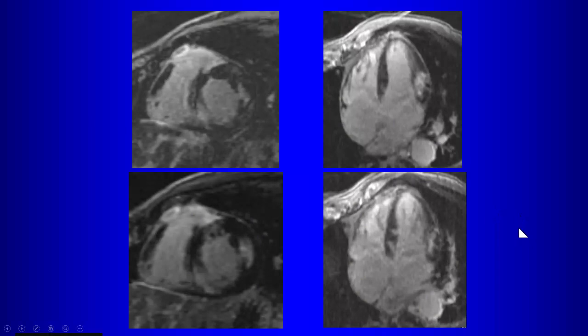Yeah, so this could be a sequela of myocarditis, right? So even acute myocarditis, if the patient happens to have acute symptoms, can give you enhancement. In the chronic phase, you can have fibrosis from myocarditis, and that can give you mid-myocardial areas of abnormal enhancement like this. And we've talked about myocarditis, the sequela being a cardiomyopathy after myocarditis, right? Is there anything else in the differential?